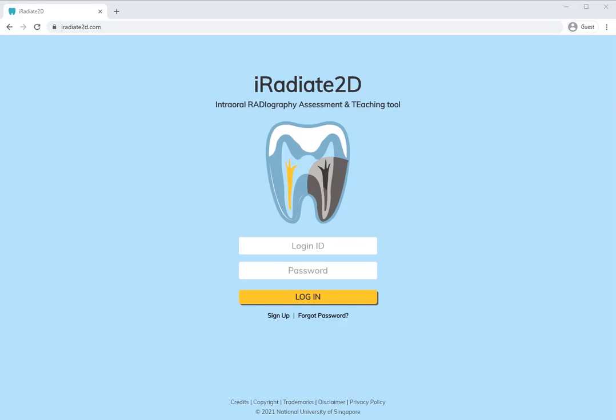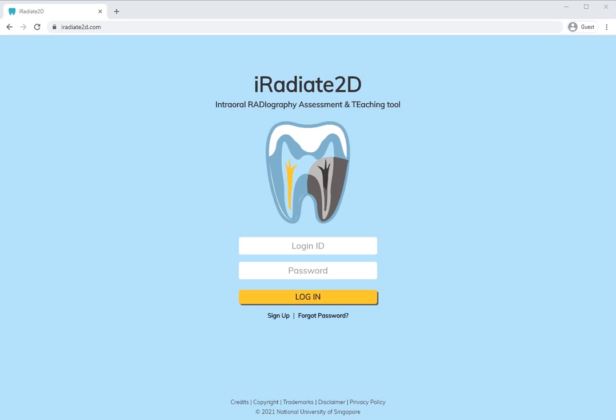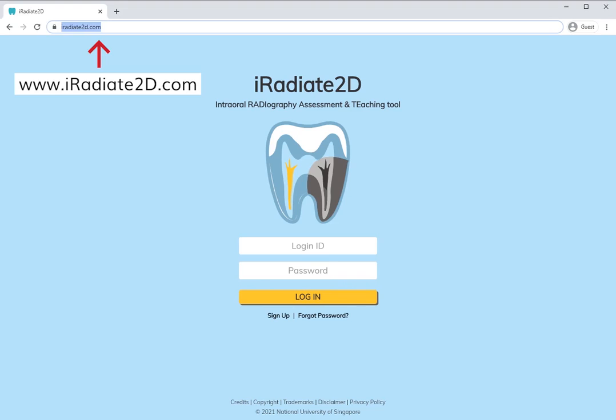Hi everyone, this video is to introduce iRadiate, which stands for Intraoral Radiography Assessment and Teaching Tool. This is a resource that we developed at the National University of Singapore to help dental students get ready for their hands-on practical sessions. So to get here, you can type in iRadiate2D in your browser, and then it will bring you to this login page.